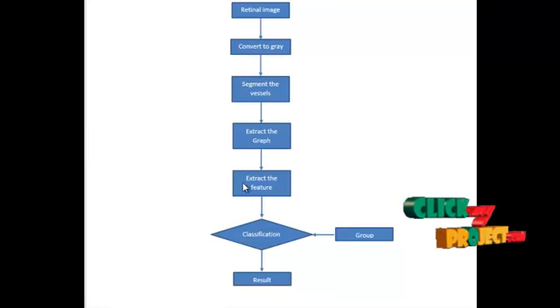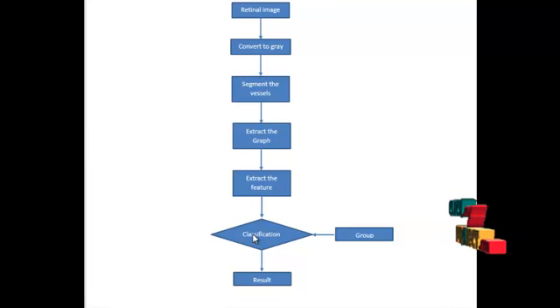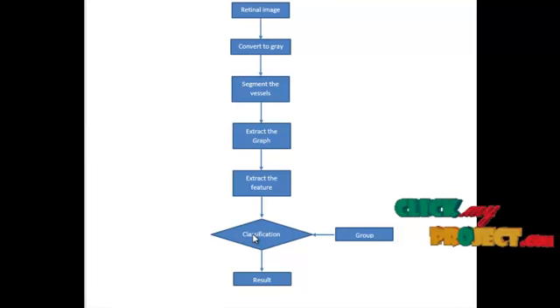Now we extract the features by centerline pixels. The centerline pixels are extracted using the end nodes, the intersection nodes and the split nodes. The features of each centerline pixel are the intensities of red, green, blue, and hue, saturation and intensity. We extract 13 types of features for each centerline pixel, and those features go to the classification process. Here we use the KNN classifier.